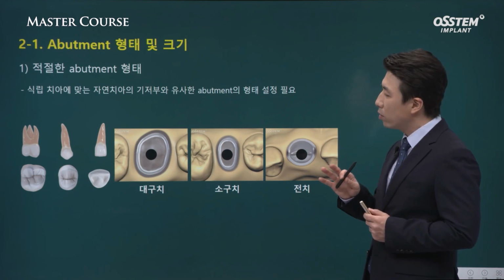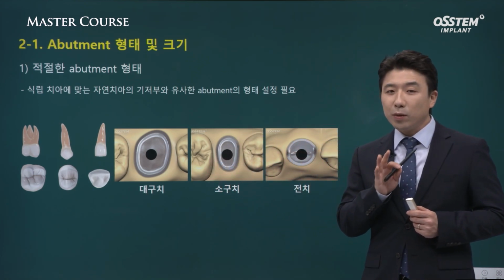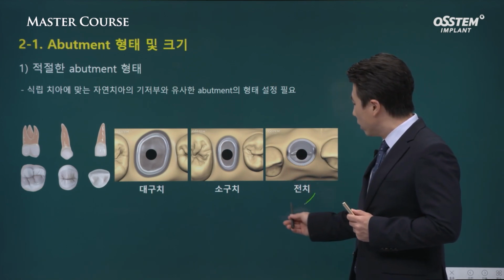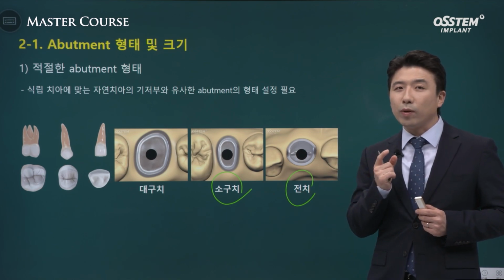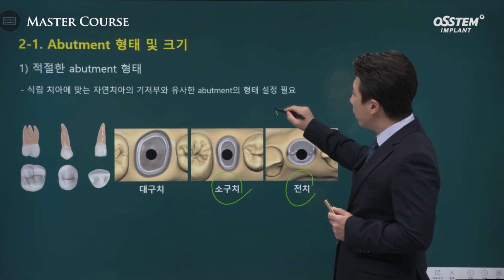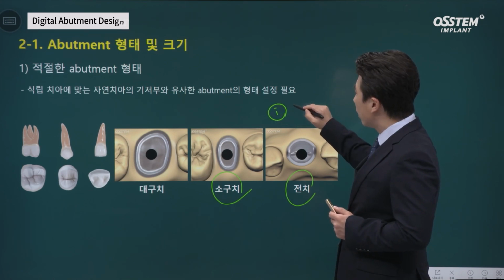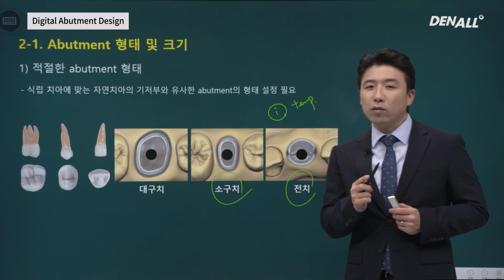Profile should be similar to that of natural teeth, especially in the aesthetic zones such as the anterior or premolar area. We need to really pay attention to detail in profile. At times, provisionals are made ahead for implants placed in these areas. We use provisionals to do tissue molding.